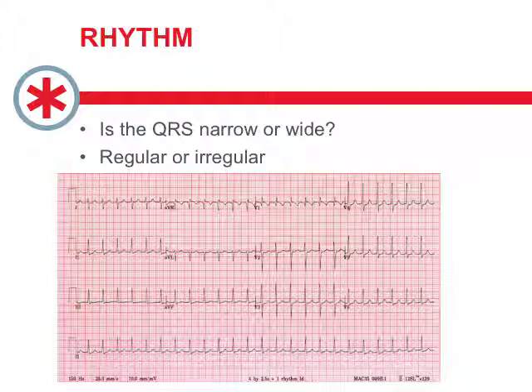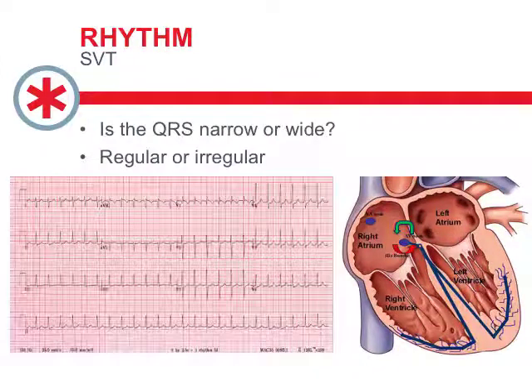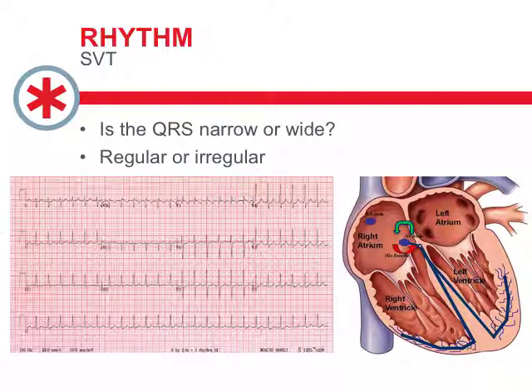All right, take a moment and have a peek at this one. So what we're looking at here is a supraventricular tachycardia, which means that the rhythm that is coming is fast, as you can see there. If you work it out, it's around 150 beats a minute. It's narrow, meaning it's coming from the atria or at least above the AV node, and it's regular, bang on regular. So when I see this, I often think supraventricular tachycardia.